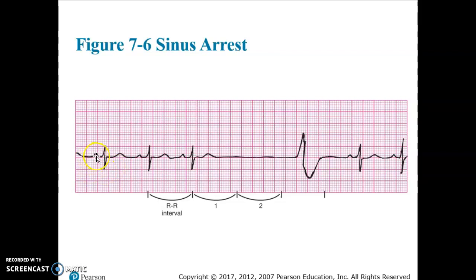We're trucking along, PQRST, PQRST, PQRST. Ooh, we got silent. Nothing happened in the SA node. Now we have this escape beat because the lower pacemaker, the ventricles, decide that they're going to fire and produce a beat to save your life. And then the SA node resumes here.